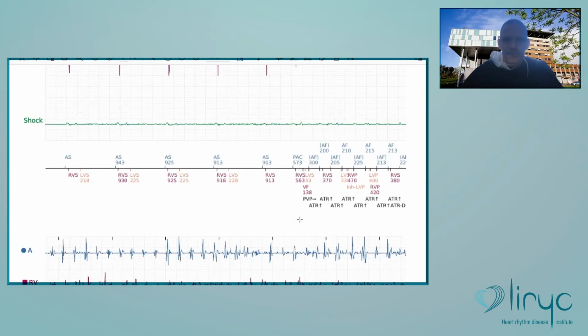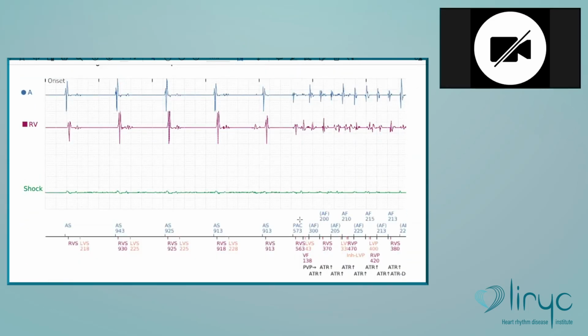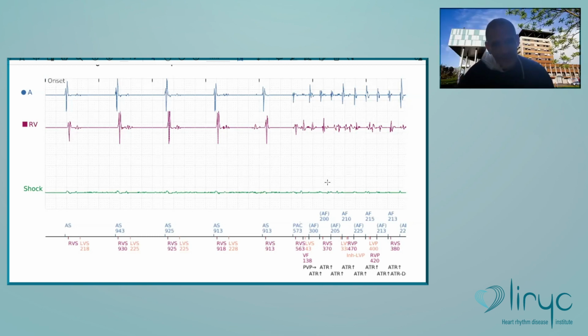Have an idea? So the shock is efficient. You have the same timing in the atrium and right ventricle. In fact, that's the case of one displaced right ventricular lead inside the atrium. Okay, that's the case here.